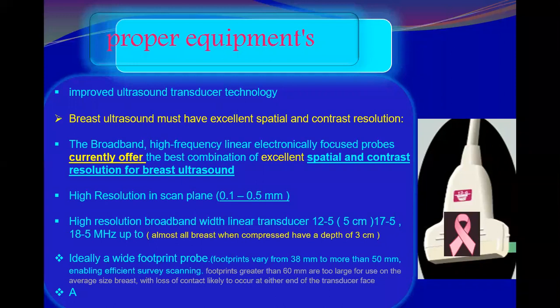The latest is now recommended to be used, because one of the studies showed that most of the breast, with optimized positioning, will be compressed to a maximum depth of 3 centimeters. So it will not be more superficial than the depth of most of the breast.